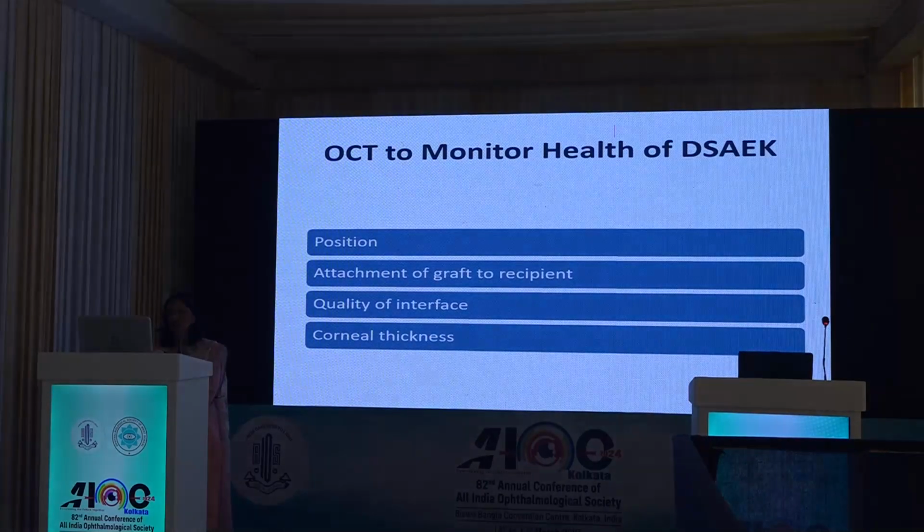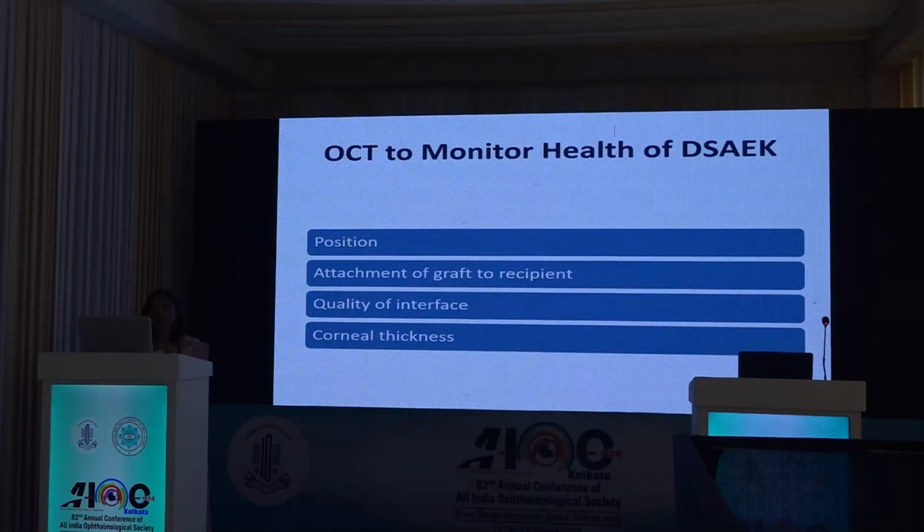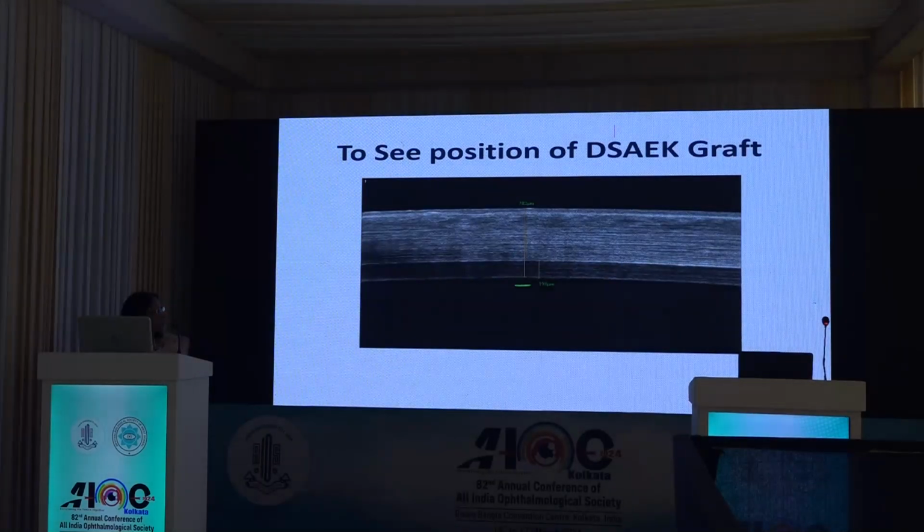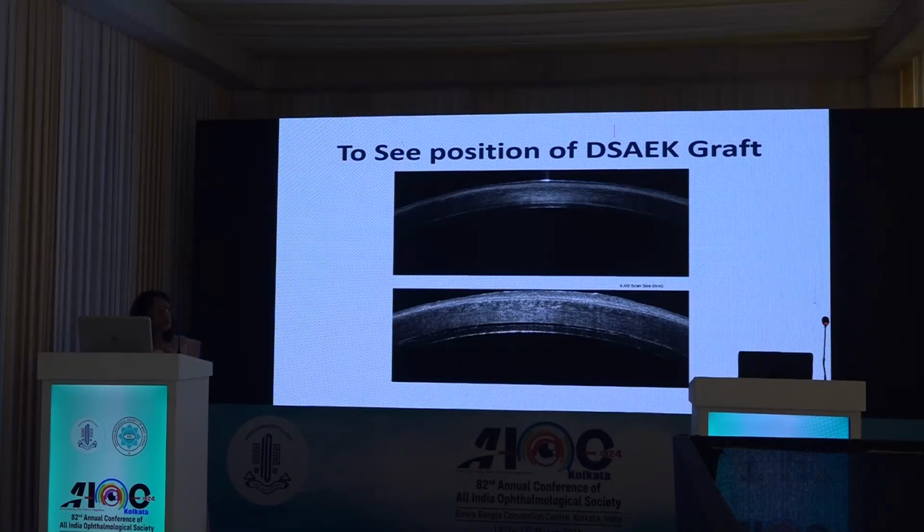Now it's very important to know the health of the graft for the corneal surgeons. As you can see in this OCT, the graft is very nicely attached post-surgery. But there is another patient in which there is a central detachment of the graft.